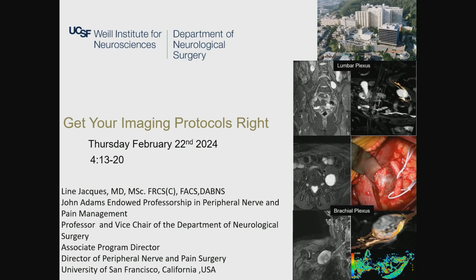And like Rob has introduced very well, the lower pictures are about the brachial plexus and the tumor origin, again from C7, and you can see very clearly the normal tract and where this tumor is arising from. And it's really important to know that in order to have a successful surgery. And the green pictures there are just showing the ADC values. That gives you a good idea about whether it is more on the malignant side, looking at the diffusion of these tumors.